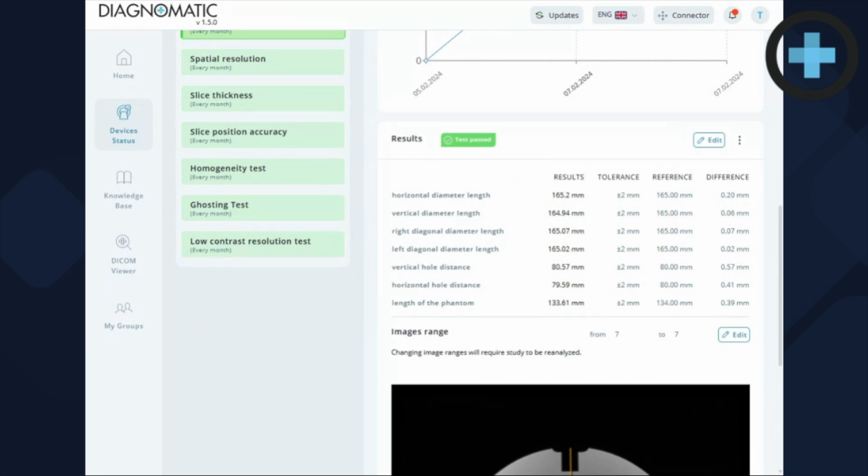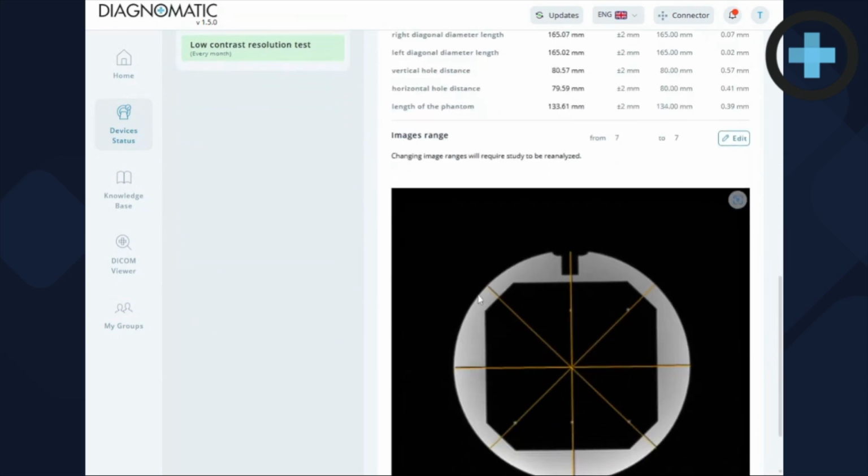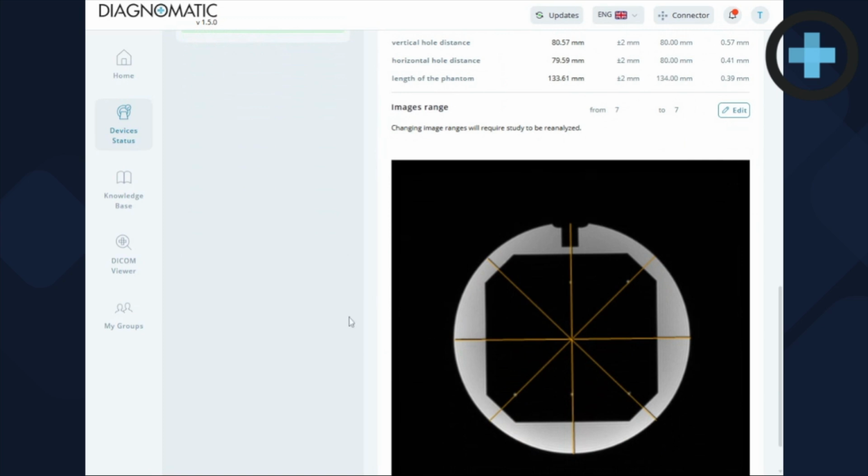So it shows that it's important to measure this. The structures in the body are accurately represented in different shapes and sizes. The measurements made in MRI images, like tumor size, etc., are reliable, and that the scanner is correctly calibrated for spatial encoding.